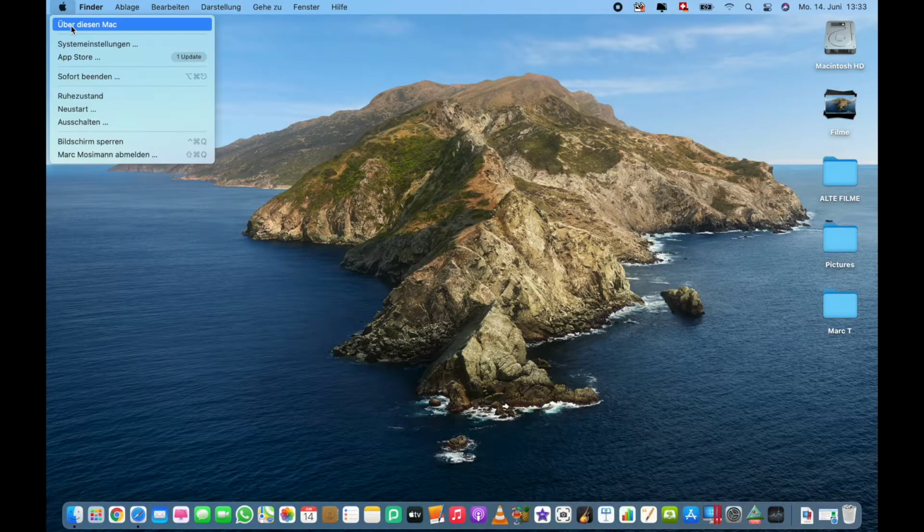So please bear with us for about 20 minutes and you will be able to run this thing on your own MacBook, running Big Sur, later on in the fall on macOS Monterey, which is coming out. So I hope you're having fun and let's get on with the steps that I'm trying to show you now, how to install it. This is my MacBook Air.